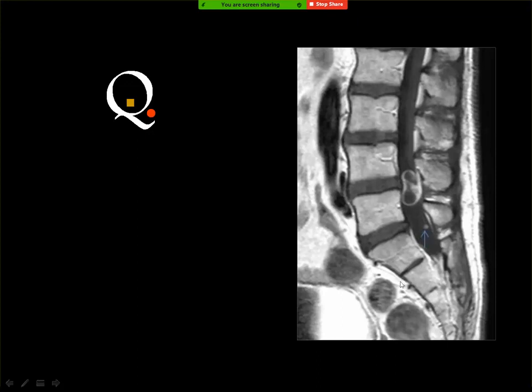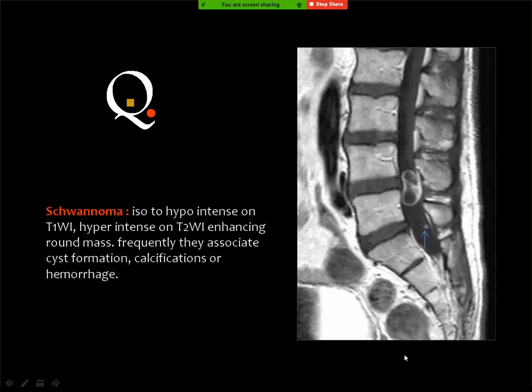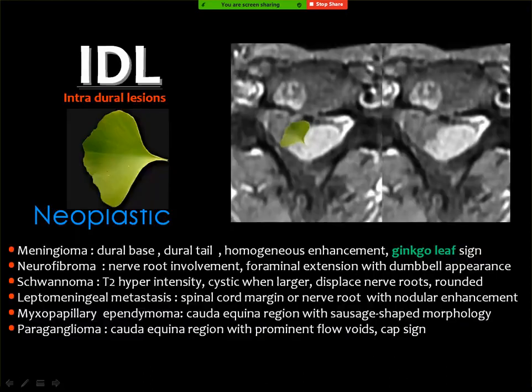then the diagnosis is multiple intradural lesions, and one of the good possibilities is neurofibroma. Then if you see cystic changes within the lesion, you have to consider the possibility of schwannoma because it has a good incidence of internal cystic changes. And this is the differential diagnosis of intradural lesions, which will be repeated many times. The main lesions are the meningioma and the neurofibroma. Also, schwannoma is considered if you see cystic changes within the lesion.